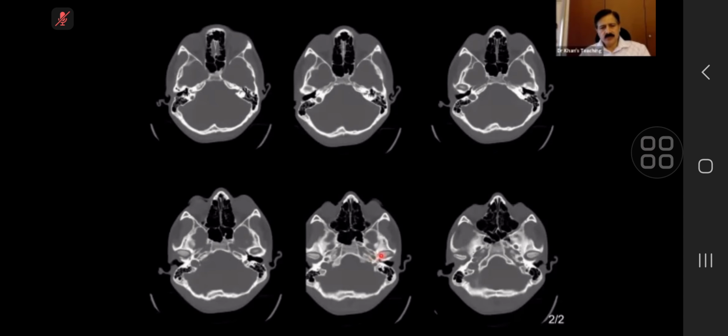What you do is that you look at a CT. Usually, these patients will have a CT also on the PACS. You look at the CT scan and go back to your embryology. Now, this is the jugular foramen on the left side. This is the sigmoid notch where the sigmoid sinus is sitting. This is the sigmoid notch on the left side.